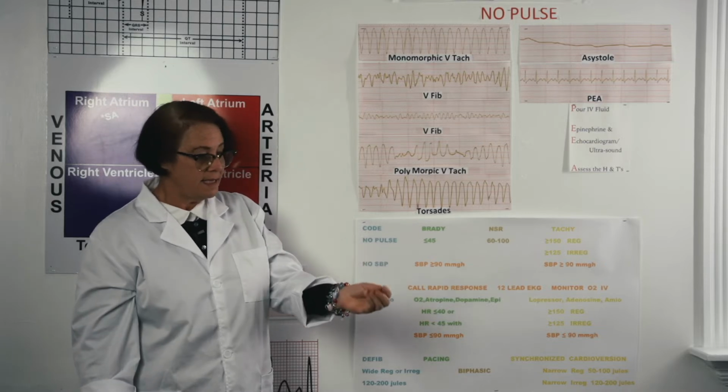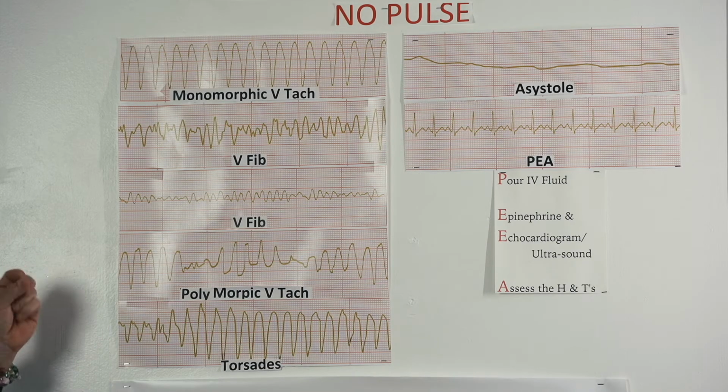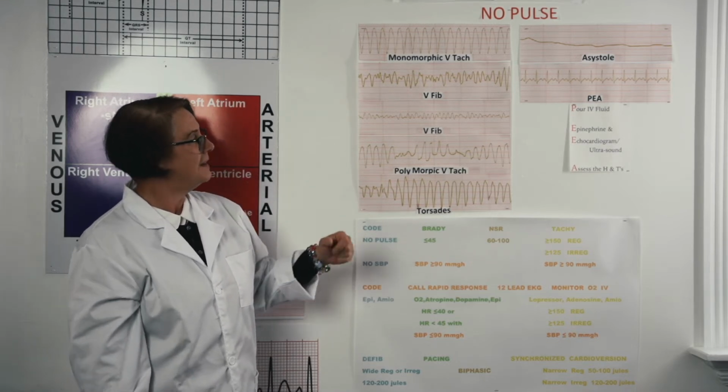So once the AED kicks in and you hit analyze, if the machine sees any of these rhythms, these are your shockable rhythms. Defibrillate immediately and resume compressions and oxygenation. But keep in mind, when someone's doing CPR, you can't read the rhythm. But once they stop, if any of this is seen, defibrillate immediately and resume compressions and oxygenation.